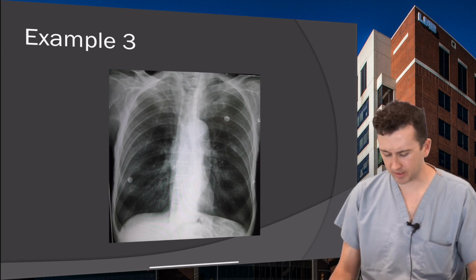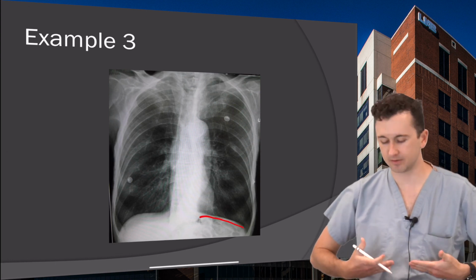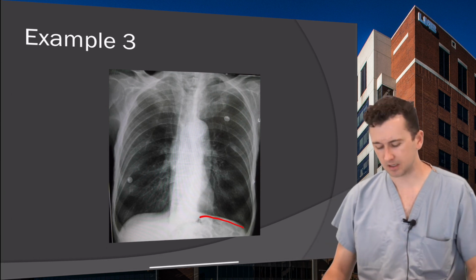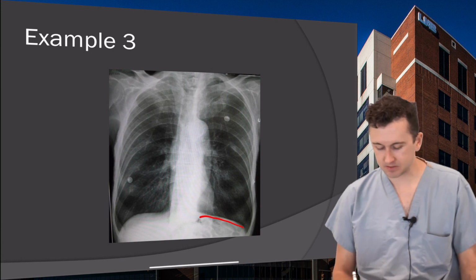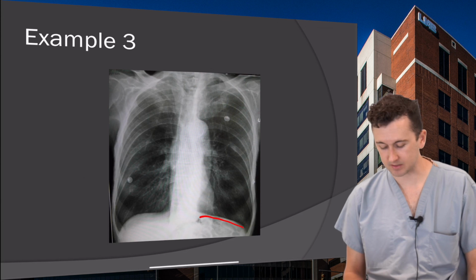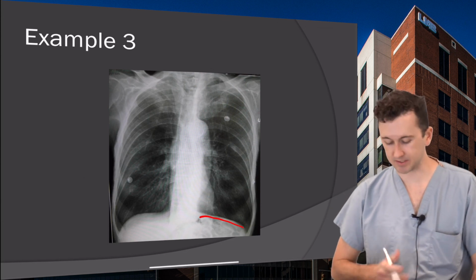A few other things to point out is, this patient has relatively flattened diaphragms. Again, that's because they're really using their diaphragm muscle to try to contract their lungs to get that air out. And so over time, you'll see these flat diaphragms. The other thing is, at first glance, his heart looks kind of funny, but the reason for that is if your diaphragm is not flattened, the heart generally rests on it.